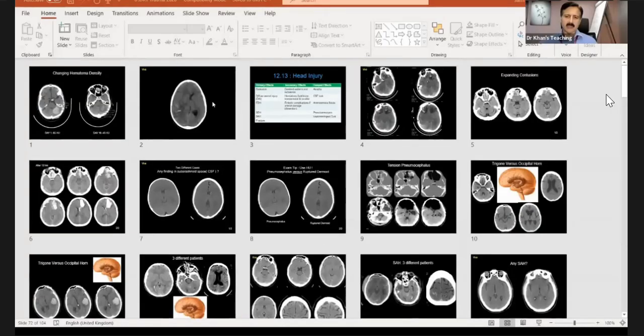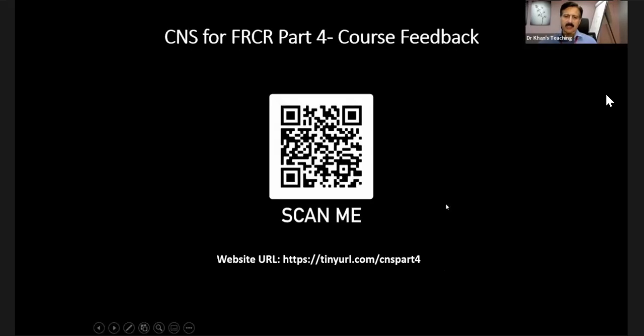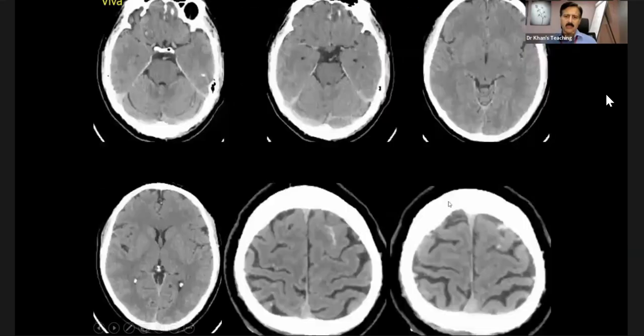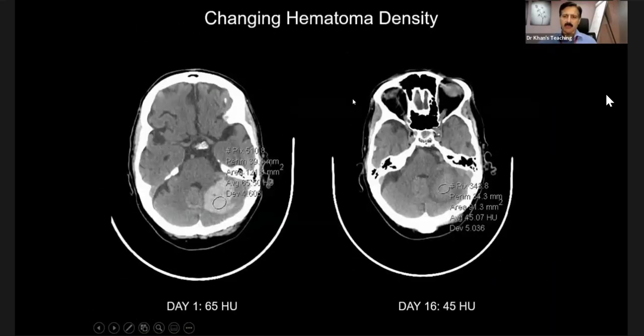Okay, now we crack on. You are going to enjoy this, all of you, because you report a lot of trauma. So it's going to be just many cases, but we will go very fast. And the viva things and things like that, I think I have got it the other way around. So, candidate 6, can you now see my screen changing, hematoma density? Yeah. Okay, so this is a teaching slide.